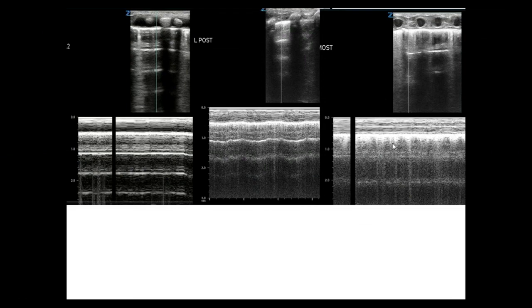Now you can identify, instead of just sea, the sky, sea, and sand. It will appear like a granular appearance of sand at the surface of the lung. So that's a lung after resolved pneumothorax, post tapping of the chest by needle.